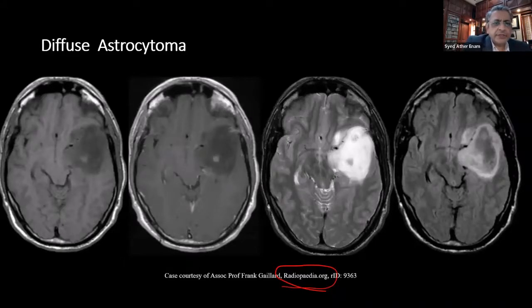So notice that in this, sometimes you also notice these things. So this is T1. This is T1 with contrast, right? You do see that there is an enhancement over here, but then there's a difference in intensity across this, right? And that's the part that is enhancing more. And on a T2 weighted image, it looks circumscribed. And on FLAIR, again, not much edema around it. But then the main thing that you notice over here is what? That the uncus is herniating significantly, pushing. The midline is getting pushed, right? The red nuclei are all getting pushed.